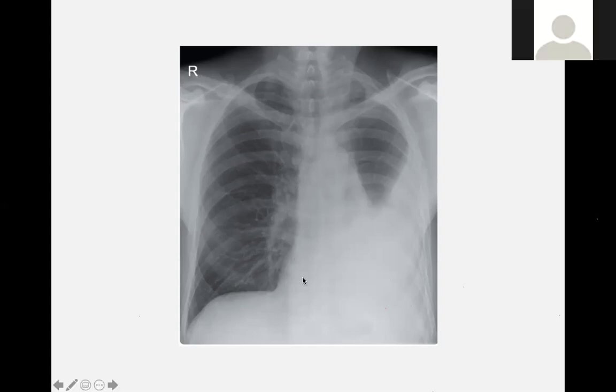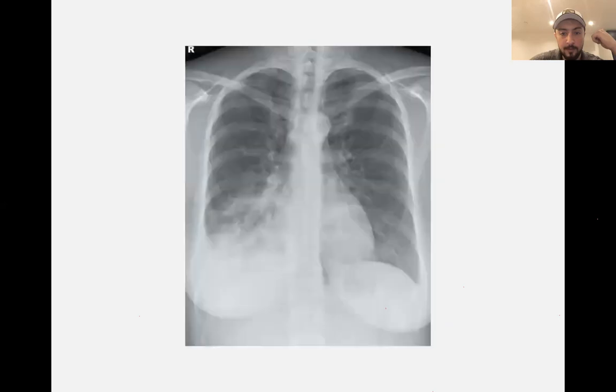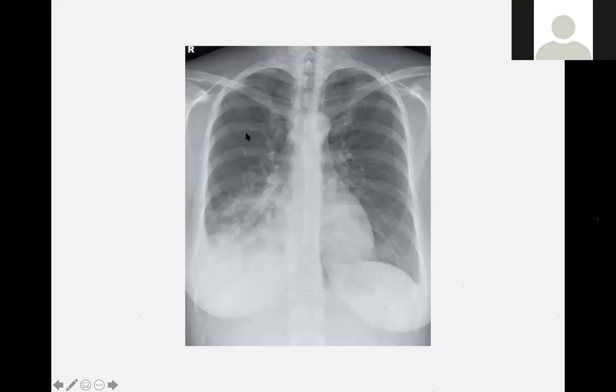Okay. Khalid, for the X-ray before this one, was it a PA or an AP film? Yeah, actually, thanks for reminding me that. Let me go through it. So for that one, this is an AP because you can see here the scapula. It's covering the lungs, behind the lungs. It's overlapping the lungs, as you can see in this one. So you want to use the scapula to see if it is AP or PA. If it's overlapping the lungs, then it is AP, anterior posterior. Okay, thank you. No problem.